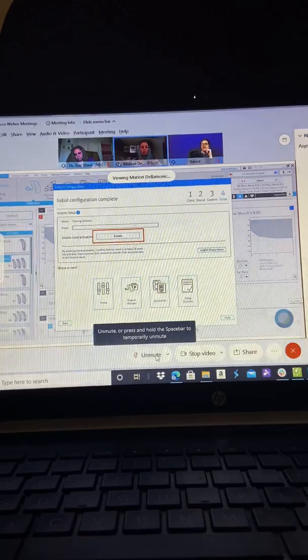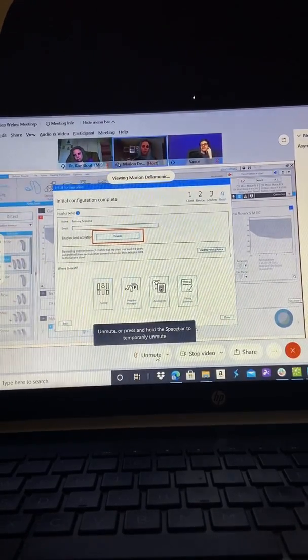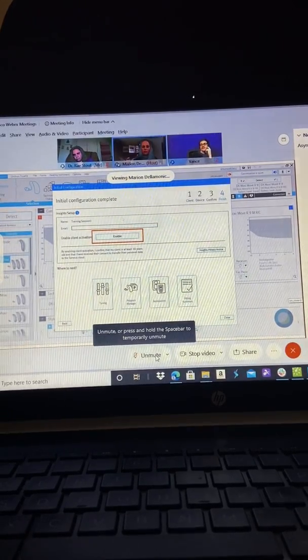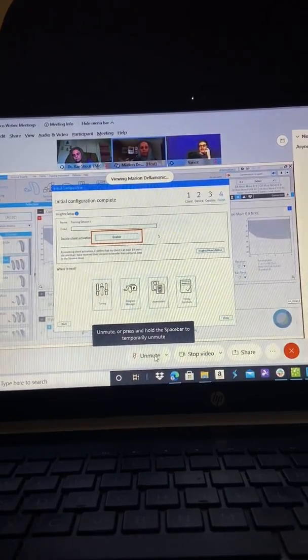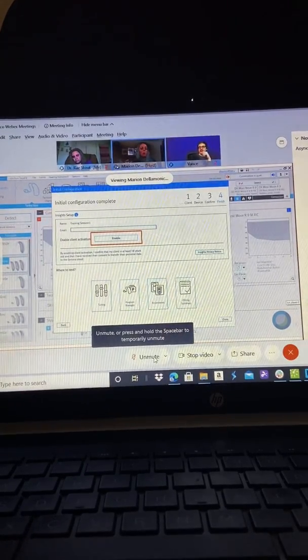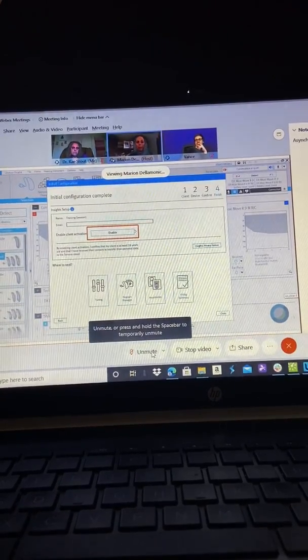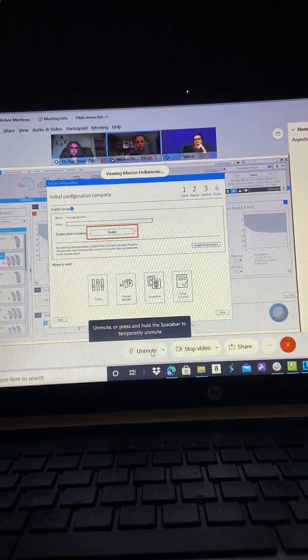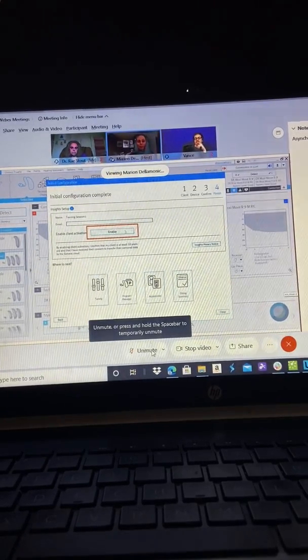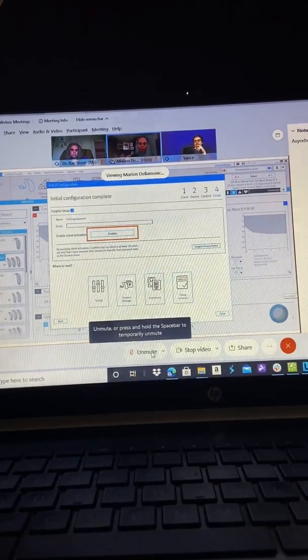And it's incredibly HIPAA protected, incredibly GDPR, the European version of HIPAA, protected as well. So in order to opt in on the software per patient, this is the screen that you'll see. You guys have probably been seeing this without this section, right? Okay, so Ray's saying yes, thank you for nodding, Ray. So once you're logged into my Unitron in TrueFit, you'll start seeing this pop up at the final first fit screen. And I'm going to highly recommend that you just click enable for every patient, whether or not you're going to use remote adjust, because it's just going to save you a step later.